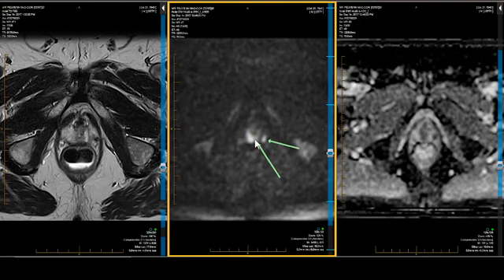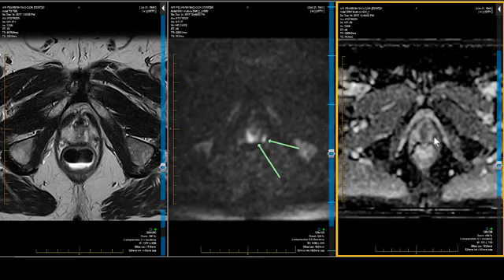So what has happened here? When we went from the B-value of 0, which I haven't shown, to 400, to 800, to 1200, to 1600, this area got brighter and brighter and brighter. That's pretty self-explanatory. If we correlated this area with the ADC map, let's do that. Let's look at the map. That's the exact spot. The diffusion is restricted. The velocity is low. So this parametric map shows low signal intensity.